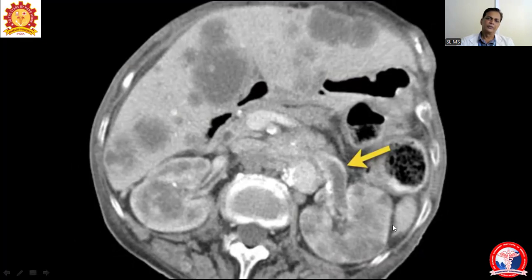Here, very important thing again is when there is carcinoma. Here we are seeing few findings. Kidneys have multiple hypodense areas, non-enhancing areas, abnormal areas, as well as liver also has multiple abnormal areas. Hypodense, non-enhancing areas are seen, and the margins are not well defined, so that goes in favor of malignant regions.